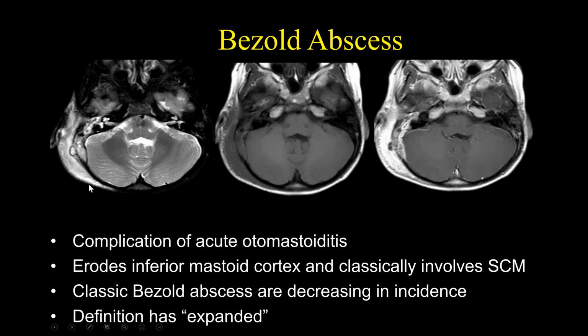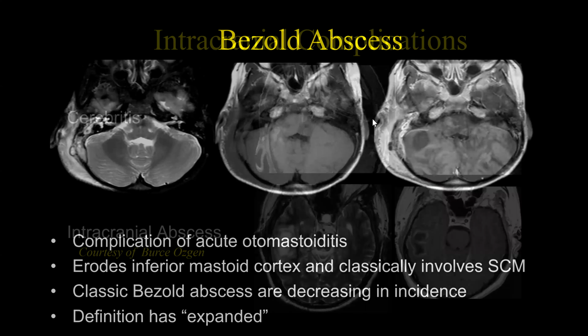And what this is, is a diffuse phlegmon and diffuse soft tissue swelling overlying the mastoid tip. So in a way, it's almost like that Pott's puffy tumor that's overlying the frontal sinus. It's somewhat similar to this, but this is sometimes described as Bezold's abscess. So this is a diffuse phlegmon overlying the right mastoid, with infected right mastoid air cells.